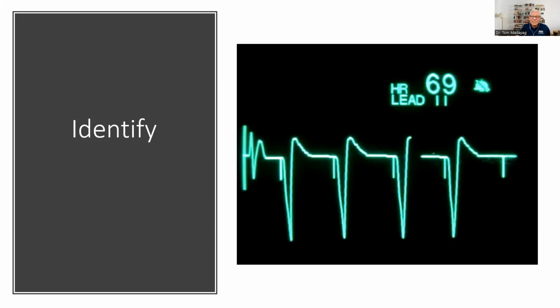Okay, so let's see. This is how you responded. A lot of you said a ventricular pacemaker with loss of capture. Some of you said ventricular pacemaker with loss of capture and sensing. The correct answer is it's both loss of capture and sensing. So let's see and discuss why that is.